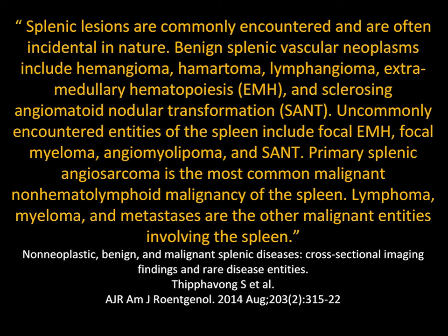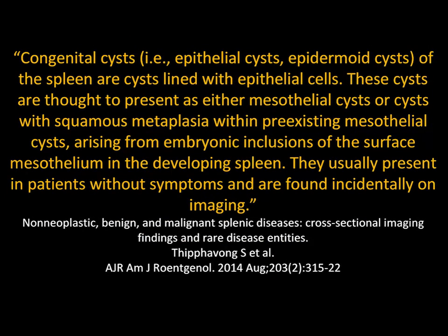There are a range of other lesions in the spleen. The majority are going to be vascular. Some of them I think we can recognize easily, like hamartomas. Extramedullary hematopoiesis is super rare, but then it's a huge spleen and it has bony findings as well. And things, of course, like angiosarcomas are hypervascular, the patient's sick. Mets, the patient often has other findings. So again, there's a big differential in splenic lesions, but I think we can do well.